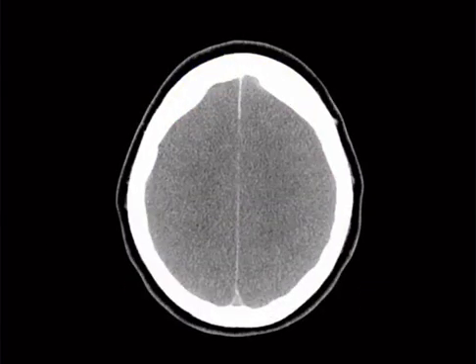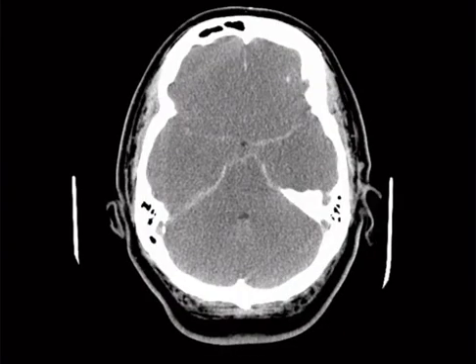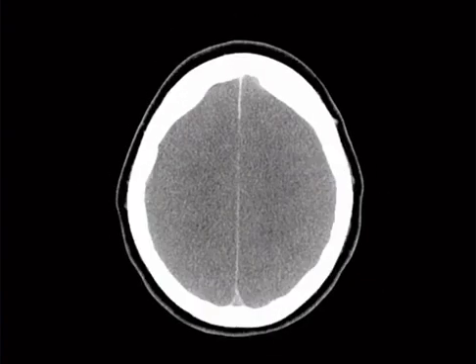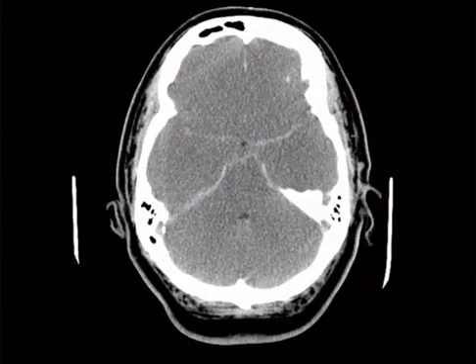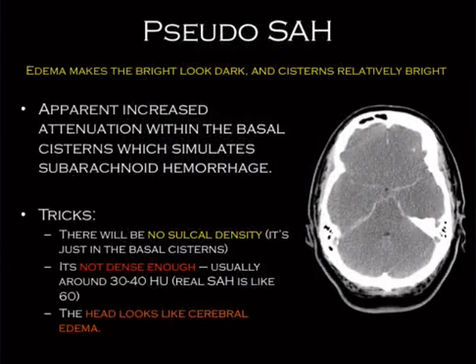All right, so here's the next case. This is a scrollable one. Move up and down here. Move back. All right, so what do you think? Does this guy need a CTA? He does not. So this is a trick.